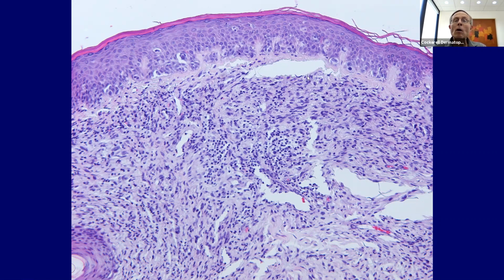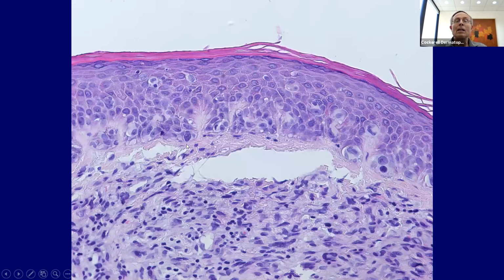But then we always look at the epidermis too. What if there was a contiguity with the epidermis? Good, somebody said melanocytic. And so yes, melanocytic neoplasia. And then you can see that these melanocytes, there's one that's hyperchromatic here. It's a little bit larger here. There's some pagetoid spread of melanocytes over this area here. So maybe this might be a variant of a melanoma.